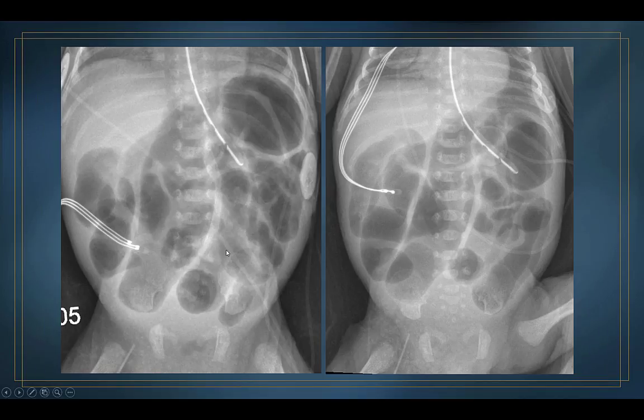All right, this is a patient that on multiple radiographs had these very abnormal findings, and I will discuss this further in a moment, but he certainly has asymmetric bowel distension. He has too many elongated loops. Some of these have to be small bowel. They can't all be colon. In fact, none of them may be colon. And this was, I think, the next day.